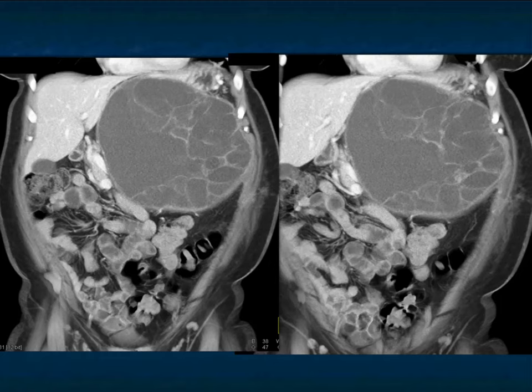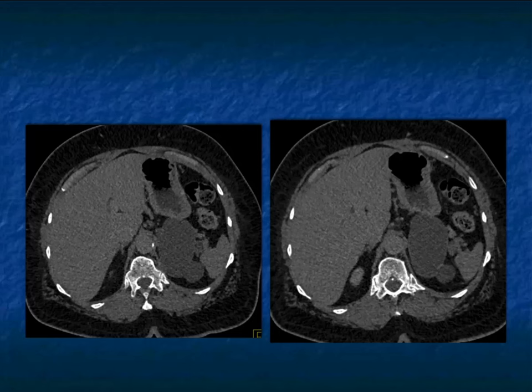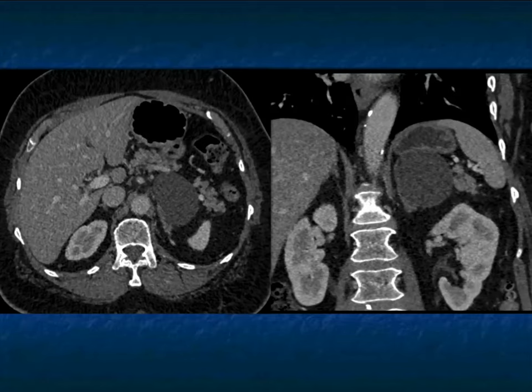And yes, we try to look for the adrenal, but when you have a large enough mass, it's hard to find the adrenal, and then you're not certain is the lesion pushing on the adrenal or simply coming off the adrenal. And here's a case we had recently, which again was sent to us probably as a benign cyst of the left adrenal gland, non-contrast appearance, well-defined. Maybe there's like a little septation, an additional cyst off the primary cystic lesion, but it's water density. So to me, I'm thinking about a simple cyst. I'm thinking if that's not the right answer, it's a lymphangioma. So I'm thinking benign.